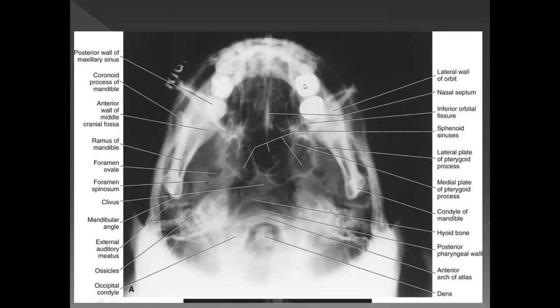All right. But in most of your maxillofacial radiology books, mostly for historical purposes, like I said, if you were planning an osteotomy of the mandible and you wanted to see the mediolateral dimension of the mandible, you could have done a submental vertex view. Or here you can see the sphenoid sinuses very clearly.